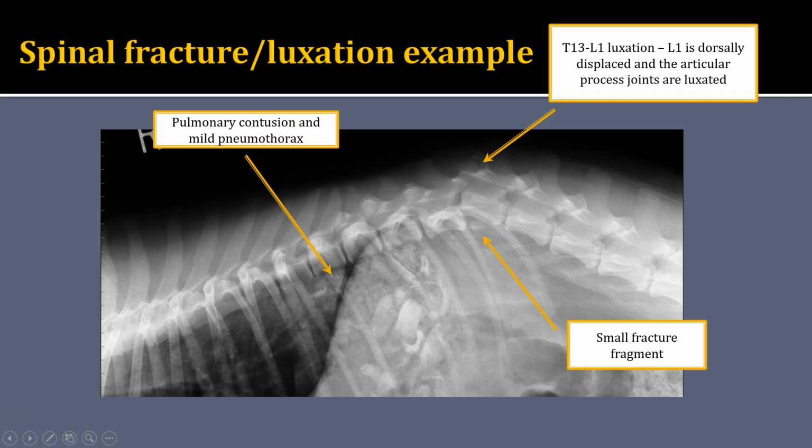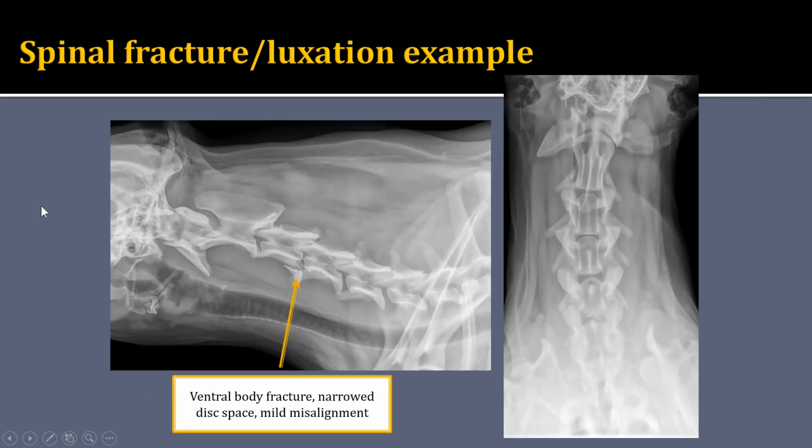We evaluated them, identified the lesion, and then did not take the orthogonal view. Here's a patient where they did obtain orthogonal views of the cervical spine. I don't remember what the trauma was on this patient, but it had neck pain. Probably the lateral view shows this the best.